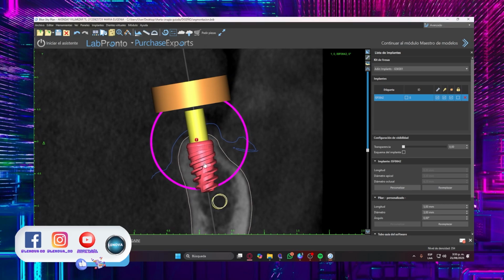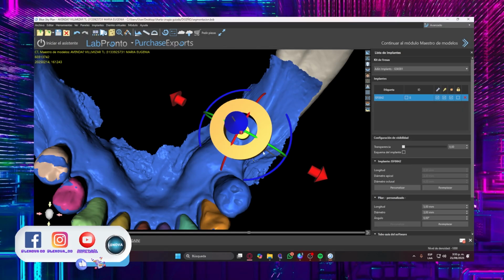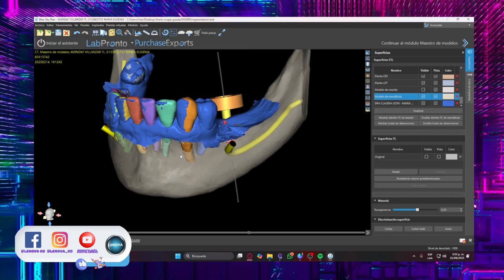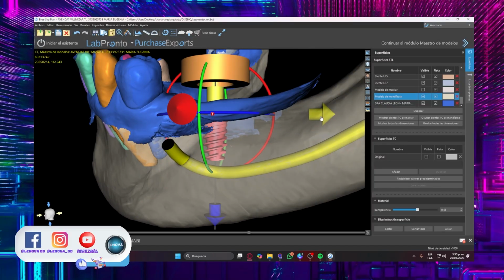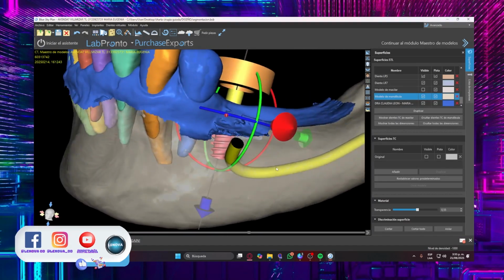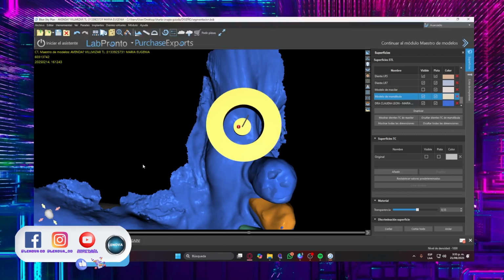Now look at what it's showing me. The surface is, and it is to be able to make this translucent, and exactly how I have to move the implant inside the bone. So I start to push it, I can rotate it. If I hit the nerve, nothing will happen here. What it will give me is an emergency signal saying, hey, that way doesn't work for me. Position it in another region. I can bring it a little closer and I could leave it there.